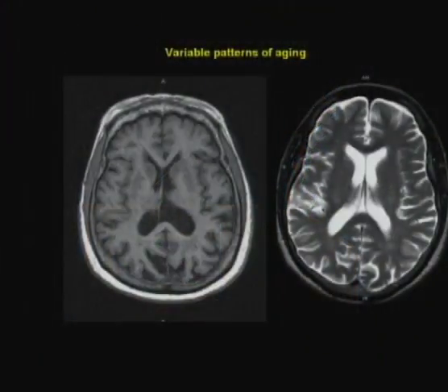Well, then, if you have a patient who is demented but has a normal-looking brain, you think of something like pseudo-dementia. In other words, dementia related to depression or possibly related to some kind of drug interaction. The problem arises when we see an older brain and the ventricles are a little big. The one on the left, the ventricles are a little bit big, the sulci are moderately enlarged. On the one on the right, they're a little bit bigger. What do you do with this? There's a wide range of normals, and what do we do to evaluate this?